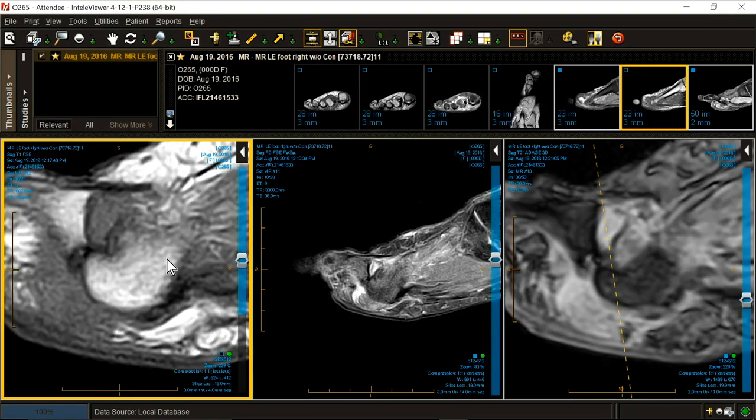Caveat. Patient has toe pain, rule out Freiberg's infraction. Rule out stress fracture. You do an MRI. The MR is negative. The answer is you missed a second plantar plate fracture if there's fluid in the second MTP. Go back and do it again. So an effusion in the second without another explanation in a woman who wears heels is a plantar plate tear until you disprove it. That will save you.